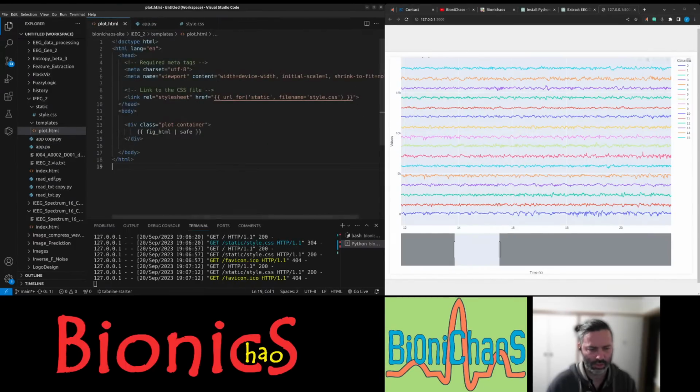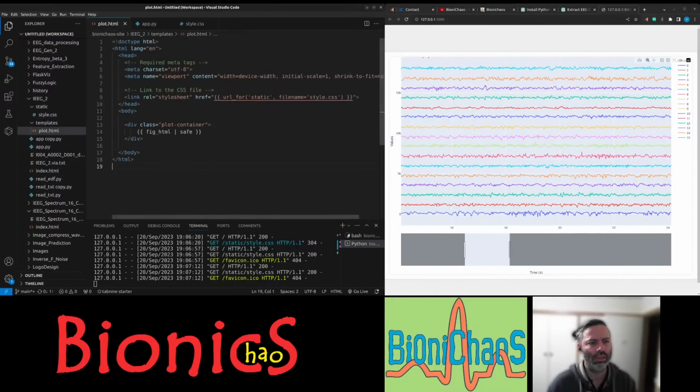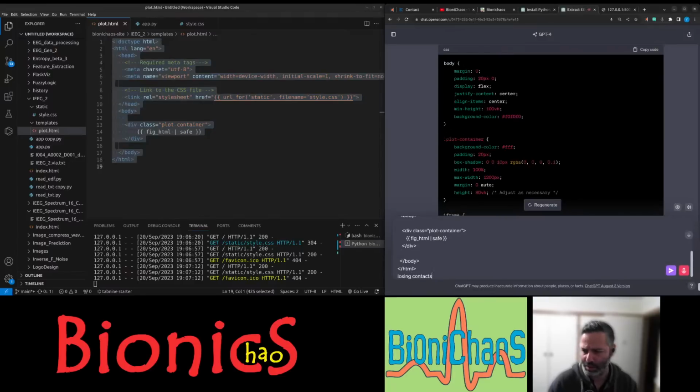Have the text at the top here, then we'll sort it out later. It's a bit like losing context already. Oh, come on.